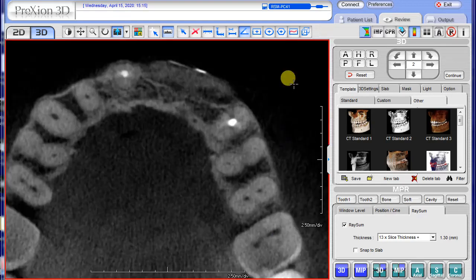Next three are geometric shapes, and here we click rectangle, and we draw, and then we release it, and you can see an area measurement along with mean, max, and min. For the ellipse, click it, and then do the same thing. Draw out an elliptical shape, and then there is your measurement.